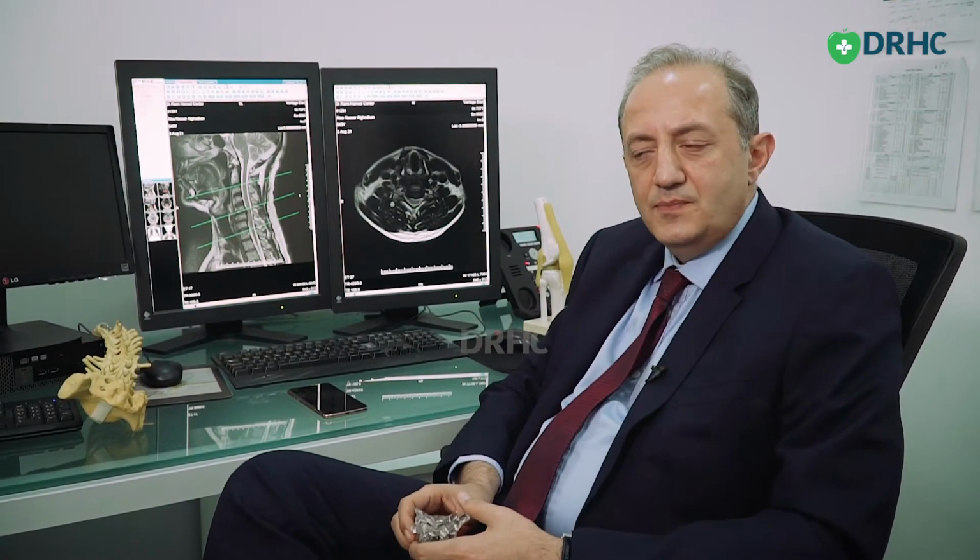Today I'm going to explain the features of MRI of the cervical spine, particularly in pathological cases where there's some disc prolapse, and how we assess for surgery and what parameters we look at in terms of justifying our decision for performing surgery, either to do disc excision posteriorly endoscopically or to do a disc replacement.